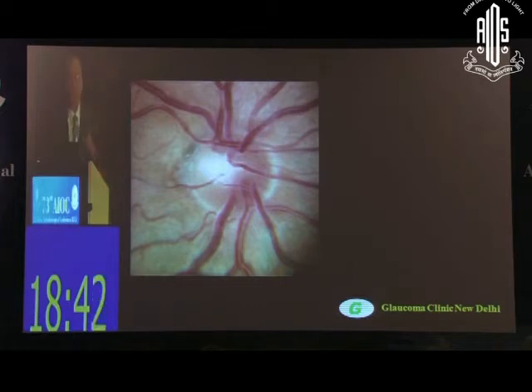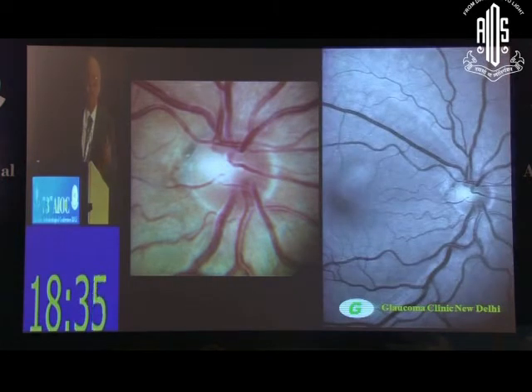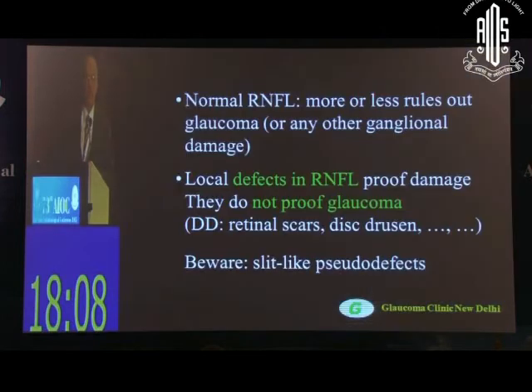Small size optic disc should have no cups. When I first saw this patient, I assumed it to be a normal optic disc. We got the fields done because the pressures were raised, and we had this little inferior nasal depression on the visual fields, which I got repeated over the next couple of days because I just felt it just wasn't right, and we had seen the patient under dilatation and were not very convinced. And then we picked up on one of the subsequent examinations on the dilatation this nerve fiber layer defect, which was actually correlating with the visual field change that we had seen earlier.